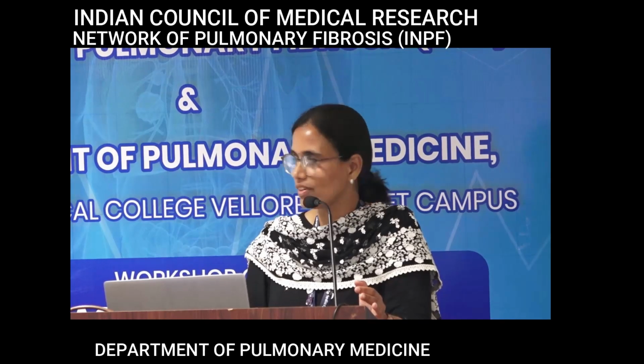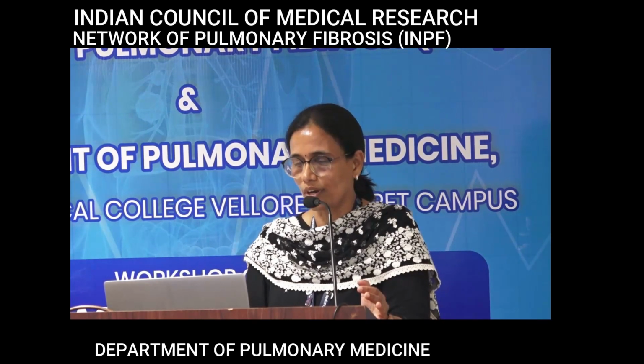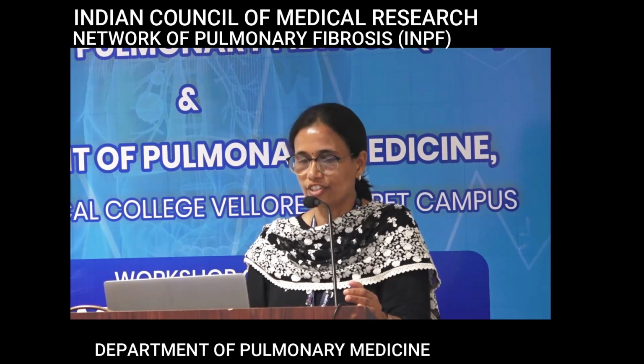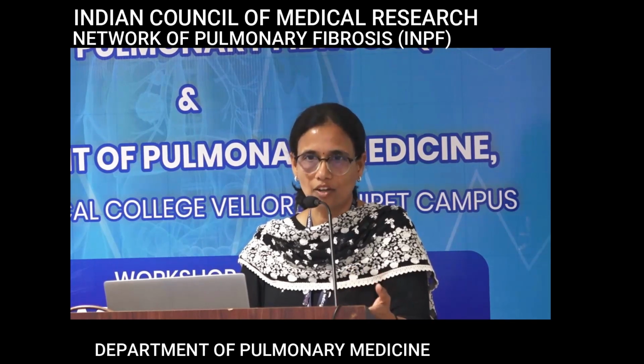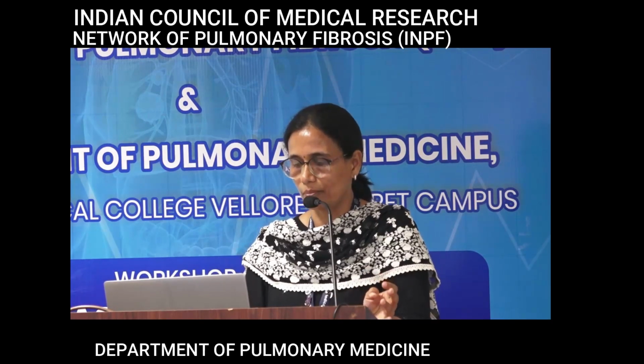What about this? Again, we're seeing a lot of nodules. How is the distribution? Are we seeing nodules along the pleura and fissures? Yes. Is it predominantly there or all over? Predominantly along the fissures and along the pleura. So this is what distribution? Perilymphatic, right? So what is the diagnosis? Sarcoidosis. So perilymphatic nodules in sarcoidosis. Other things like lymphangitis can also give that appearance.